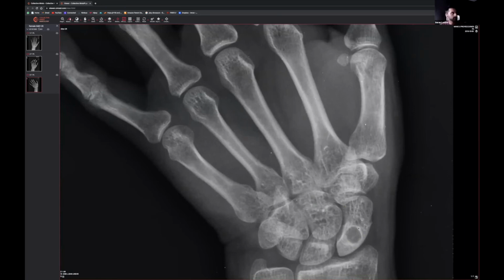sitting over here. Now, it's very well defined. Literally, I can get a pen and draw it for you. I'm not saying it could be extending over this way. You can't see bony expansion anywhere, so there's no bony expansion at all. When you look closely, there's no cortical reaction as well, so there's no reactive process going on here. No soft tissue reaction. You don't see any sort of bump over here either.